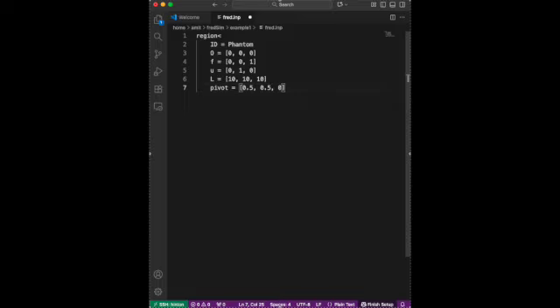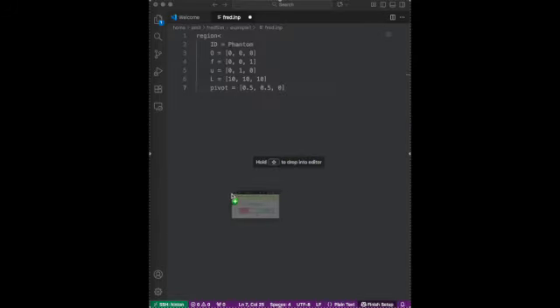Now if I set this to 0 in the z coordinate, my cube starts at z equal to 0. That means that in the xy plane the beam will still be going through the center of the xy plane, but the cube will start from z equal to 0. I think I have an image for this, again not my image, it's from FRED. They have done a good job with the documentation.